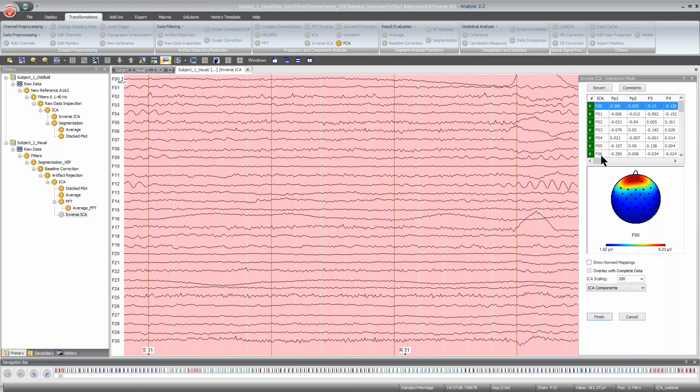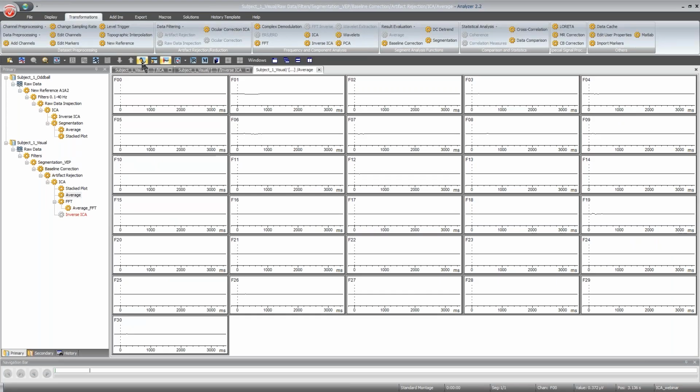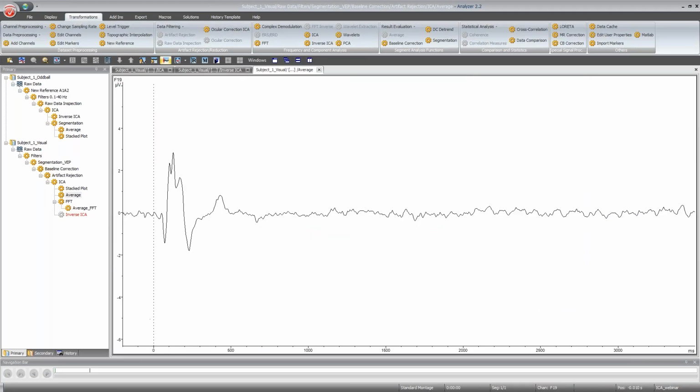And in here, in the visually evoked potential, I found a component, and this was component number 19, that looks very much like it might show our visually evoked potential, because I averaged this component. And if you look into it here, component number 19, then here very early you see big deflections, in the time range where you would also expect your visually evoked component.